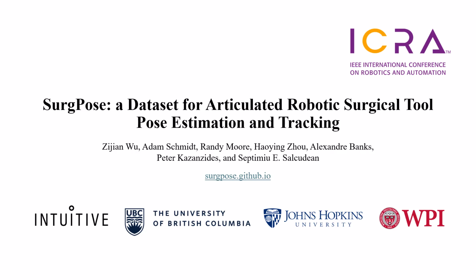We not only provide 2D key points of 6 kinds of instruments for each frame, but also include stereo image pairs and raw proprioception data. Compared with existing datasets, SurgPose is a larger, more comprehensive, and higher quality benchmark.